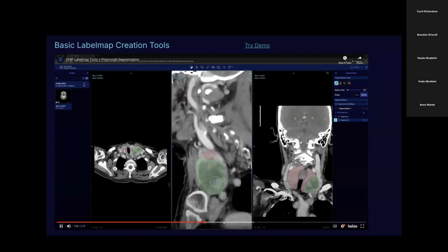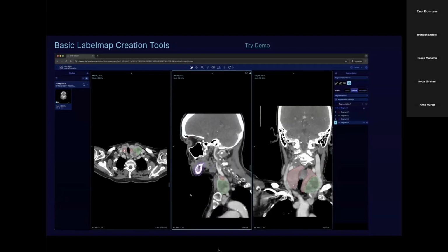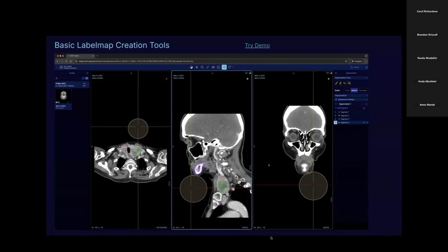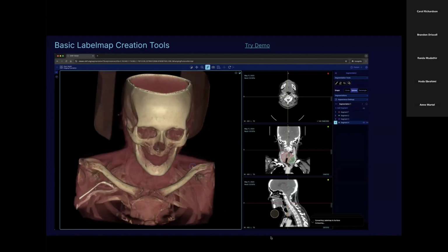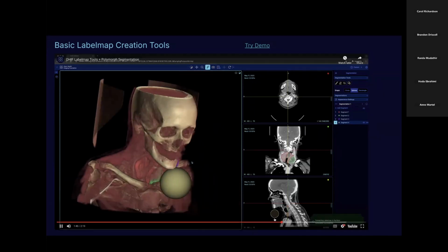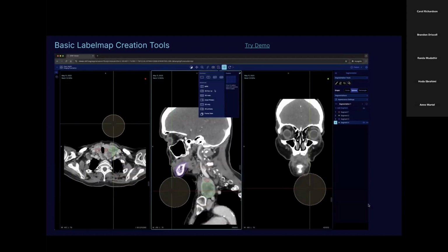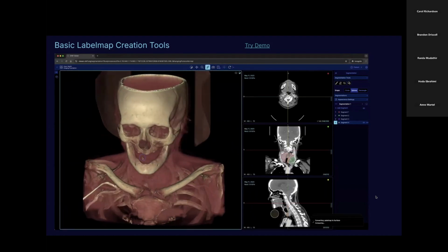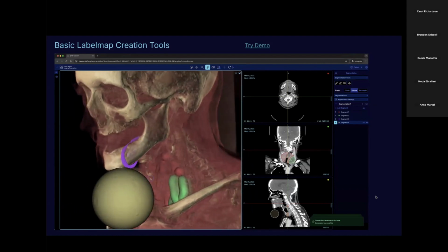And a little bit further, I'm showing our shape tools. So here I'm drawing a big sphere. And in a moment, I will switch the layout to a 3D primary. And that's exactly where the polymorph segmentation kicks in. You can see the interactivity of the 3D viewport while we're going, and there is a notification on the bottom right that says I'm processing a 3D conversion to surfaces. All of that is done in real time on the user device without blocking the UI.